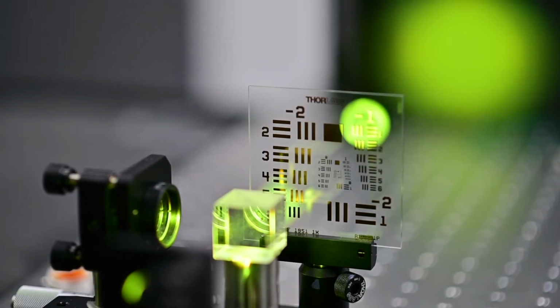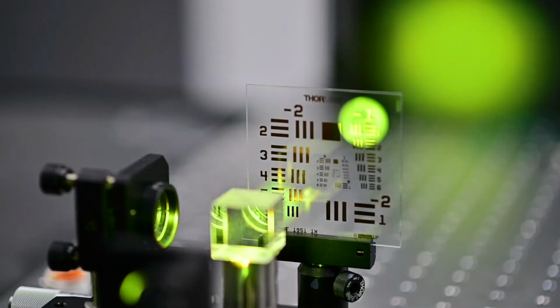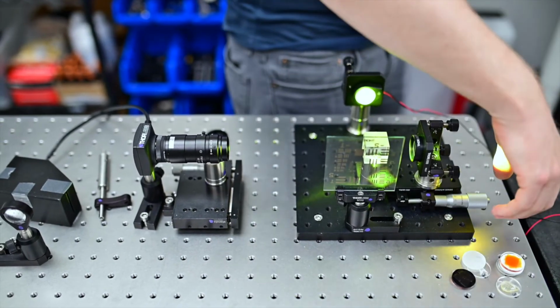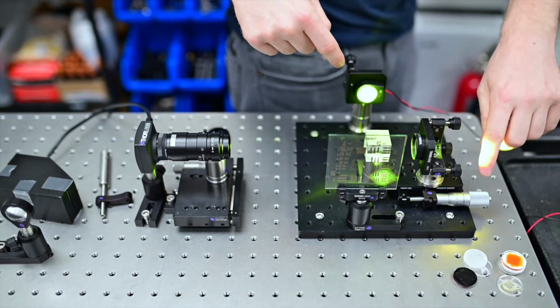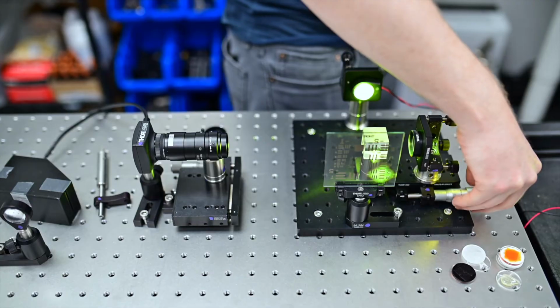At the beam splitter, the light is recombined and then sent towards a camera which is focused on the surface of the resolution target. By adjusting the length of the reference arm such that the reference mirror and the sample surface are equidistant from the beam splitter, we observe optical interference in the image captured by the camera.